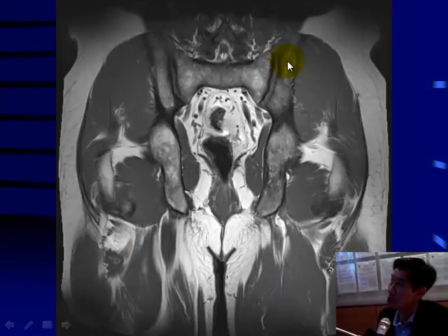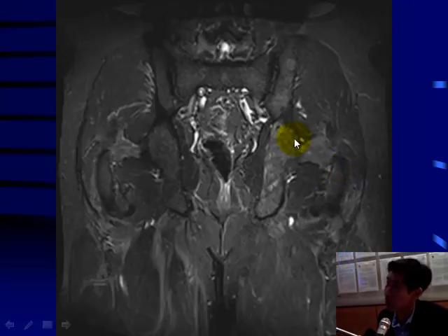The same patient in the coronal T1 weighted sequence. Again, there's enlargement. If you look at the left pubic bone to the right, notice how it's bigger here than here. So there's enlargement of the medullary space, some cortical thickening, trabecular pattern is more prominent, but most importantly, that yellow marrow is still there. The speckled marrow appearance, fibrovascular tissue on T2 weighted sequence.